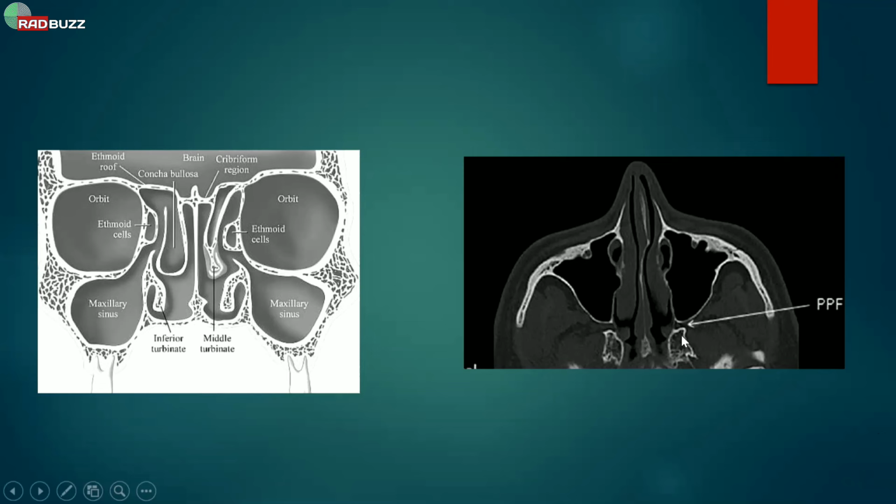Now, it is formed just behind the base of skull structures, the posterior wall of the maxilla, and this slit-like opening or an area just below the floor of the orbit. So if the orbit is going down here, just imagine posteriorly going down this place and the maxillary sinus going posteriorly here. So that's a space bilaterally, the pterygopalatine fossa or recess. If you look carefully, there's something in it. That is the pterygopalatine ganglion.